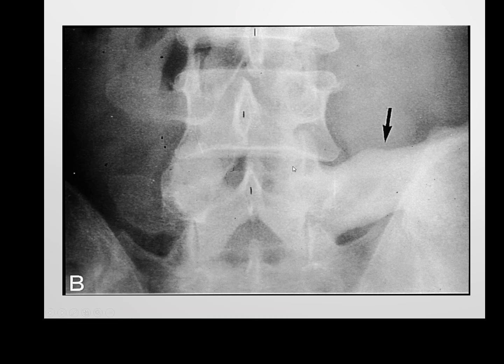And then here we have, obviously, the iliolumbar ligament coming from the posterior aspect of the iliac crest over towards the transverse process of L5, and the whole ligament is very, very bright, very dense. This has got a lovely smooth border to it. It's quite clearly not a pathological process in terms of a cancerous lesion or anything like this.